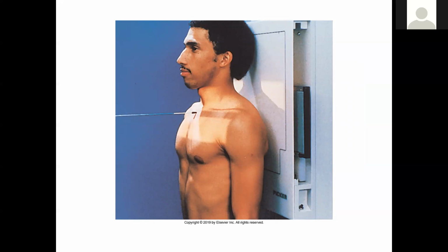Positioning using the model for AC joints. No angle, patient standing upright against the bucky, central ray going right through. Ideally, you should be able to put your central ray toward the elevated lateral side of the clavicles rather than right at the jugular notch, because the AC joints will be up a little bit, and certainly collimate more up and down.